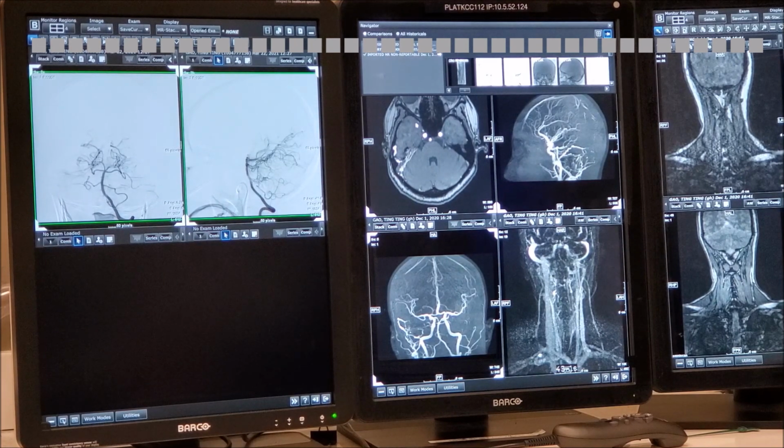You may have things like posterior auricular and others, parasitization later on. Transbony, superficial temporal. So in your mind, you build the puzzle of this thing, right? So in this area, we can predict that the primary supply will be from the meningeal arteries that we described. Middle meningeal most likely because it's so dominant. But yeah, we're going to have to do that kind of angiogram.